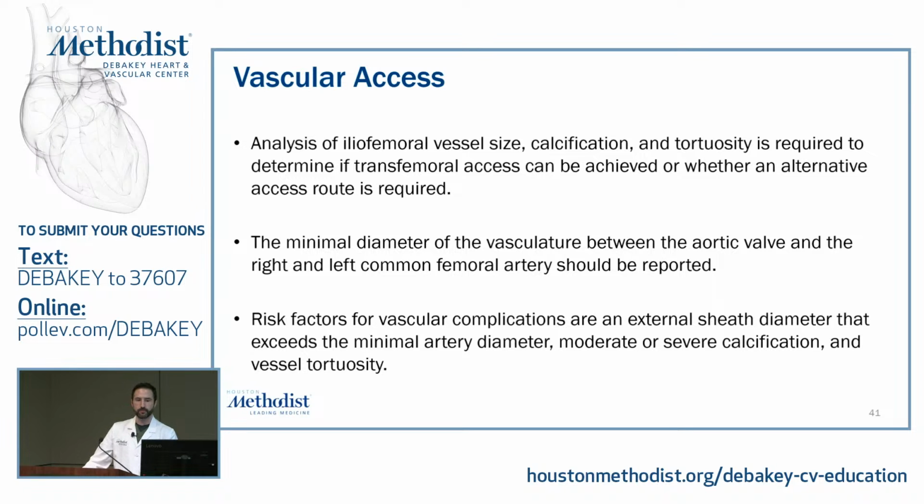Now, as we said, after the retrospective EKG data acquisition, we do a non-EKG helical high-pitch scan that goes all the way from the carotids all the way down to the iliacs. And so you can assess the iliofemoral arteries for size, calcification, and tortuosity. So that will help you determine if transfemoral can be the route of access.